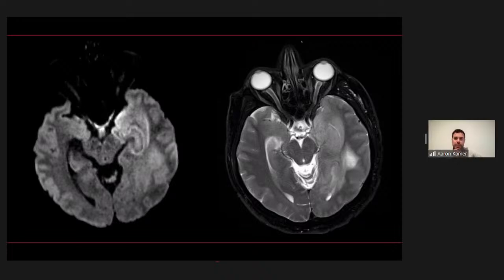Okay, I think that's a very reasonable thought. Maybe some sort of, again, herpes simplex or something like that. That tends not to affect the white matter as much. This happened to be a case of a diffuse infiltrative glioma. We're seeing a lot of weird white matter involvement, weird cortical involvement. It's spread throughout that whole area, even more widely than the hippocampus. But maybe some of this restricted diffusion within the hippocampus is related to the seizures that the patient was having from their glioma that was involving the hippocampus.